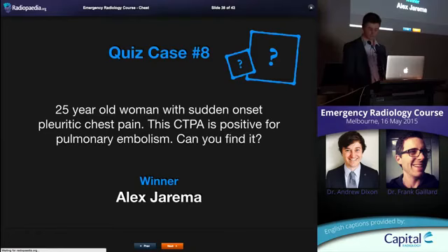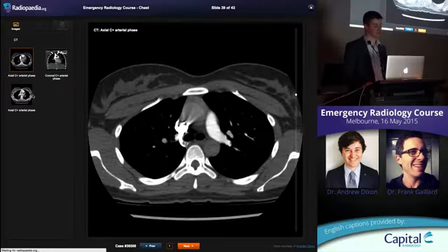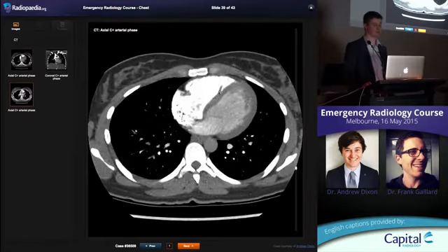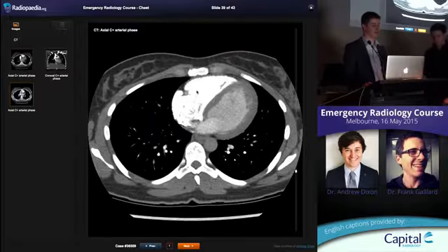Yeah, he's coming down. So, first thing I'm going to say about CTPA is, especially at our institution, the way the images come across to our PACS, the window and levelling of the scan is not appropriate for assessing for a PE. Usually it's very, very bright contrast and you get a lot of flaring of it.